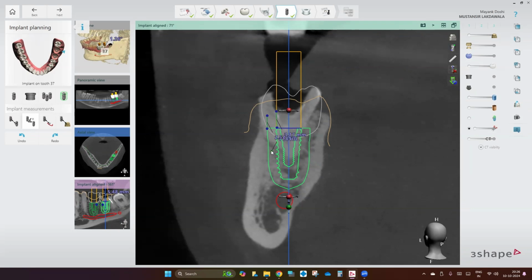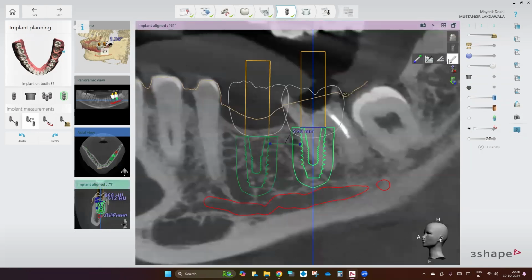See, can you all appreciate? So wherever you want to add markings, you click. Go in, go again and add one more marking कि यहाँ पे मुझे डालना है या यहाँ पे डालना है या जहाँ पे भी. Is this clear? The same will apply everywhere. Over here, वही मैं सोचूं एकदम सामने था, कहाँ चले गया. Okay? Yes, sir.